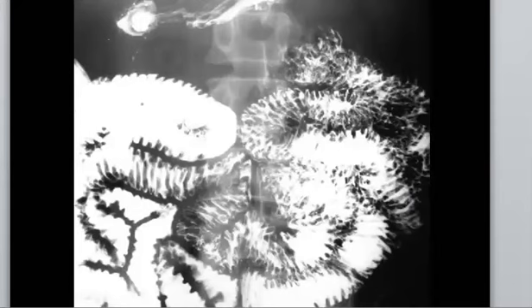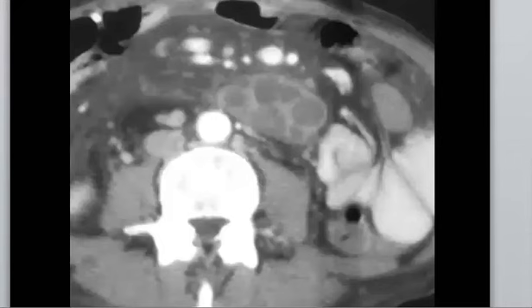So what do you think about this case, which is not very common? You can describe that there is something in the jejunum. What is it? It is like micronodularity, okay? If I mention that the jejunum has micronodularity and this appearance, can you describe?